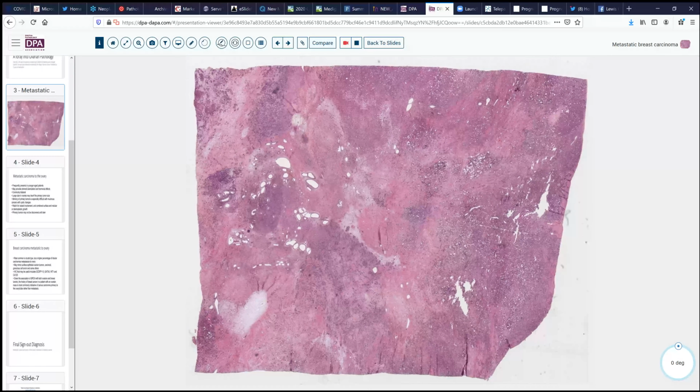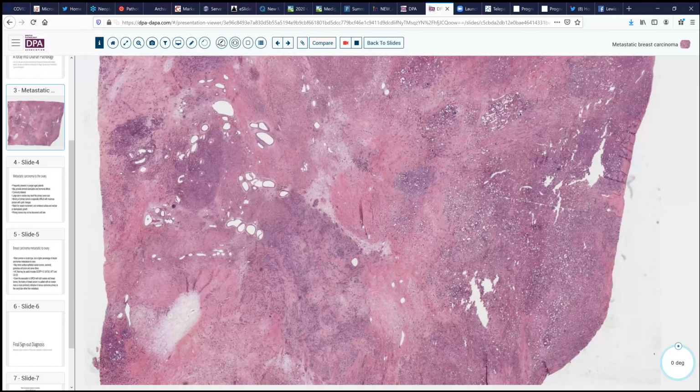It's got a fibrous background, some vessels, some bluish areas, but it doesn't look like what one might expect in the setting of a potential BRCA2 mutation carrier who might be more likely to have breast cancer and then a secondary ovarian cancer of the serous type. No, this looks to be a more diffuse process with some sieve-like areas and pale blue and variable areas. We do see a little evidence of surface involvement here as well.